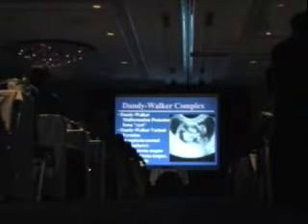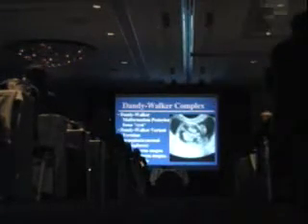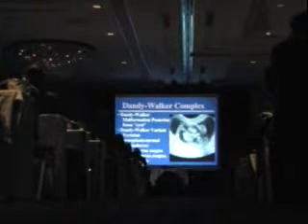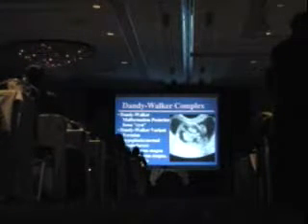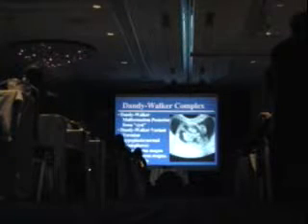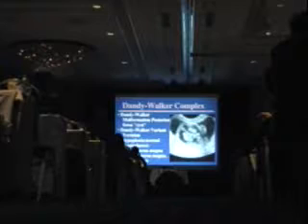So, Dandy-Walker complex. Okay, what is Dandy-Walker complex? It's basically a cyst in the posterior fossa. It's too much fluid in the posterior fossa. There are really three types of things that you can call that. First of all, the classic Dandy-Walker cyst, which I showed you on a previous slide, which is basically the fourth ventricle just forms a big cyst because the cerebellar vermis just doesn't form.